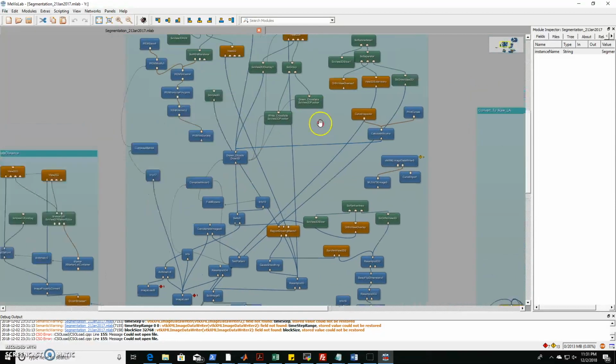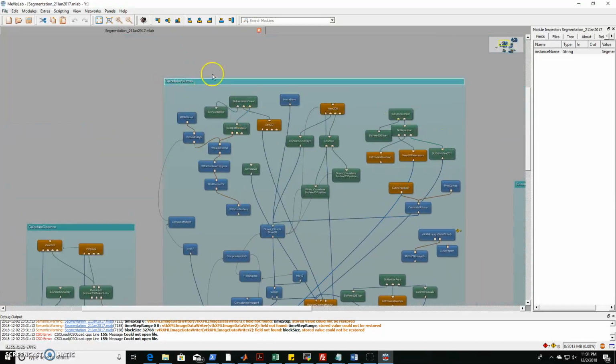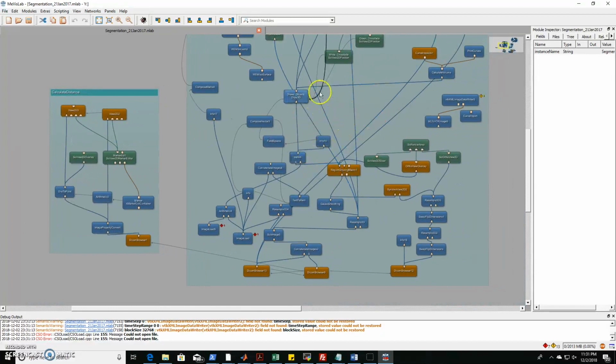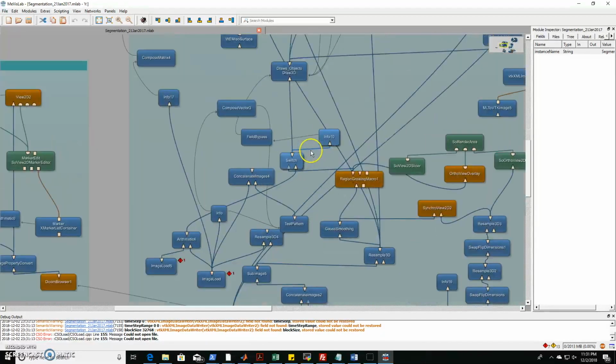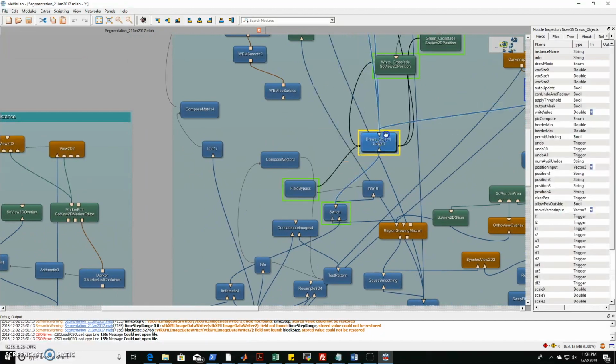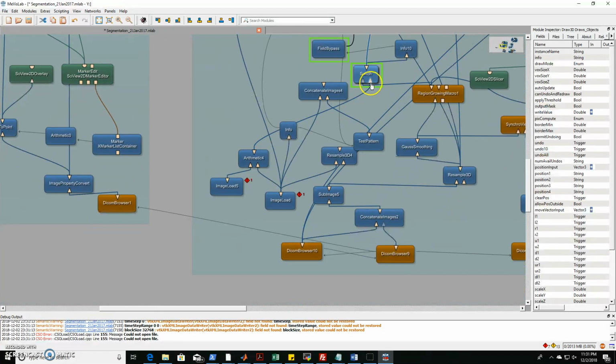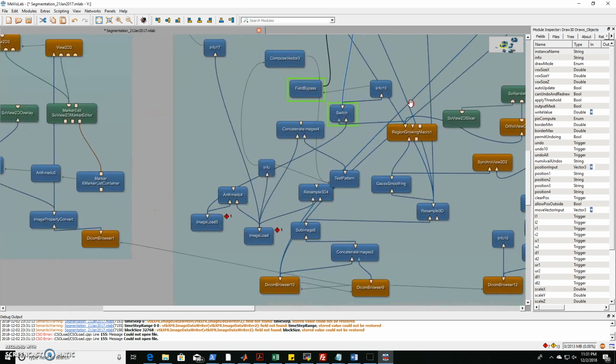The main box that we're going to be focusing on in this segmentation tutorial is the calculate volumes box. Within the box, you'll see all these different boxes that we call modules. Each one you can grasp and move around. And each one is connected to each other through these little connectors right here, so you can actually disconnect and reconnect them, but I don't suggest doing that.